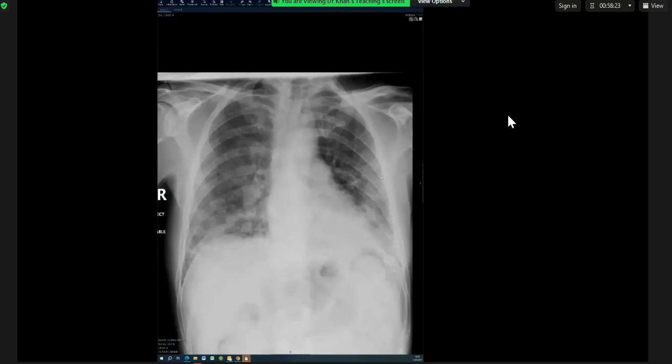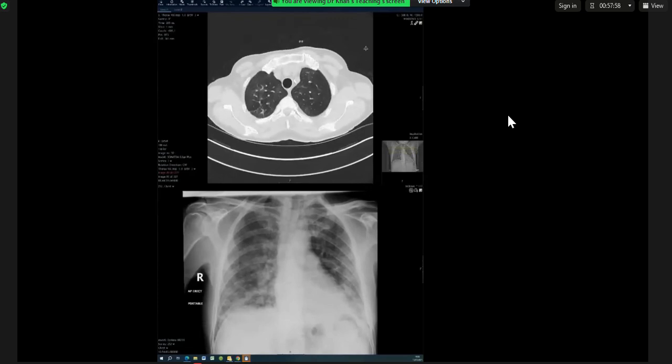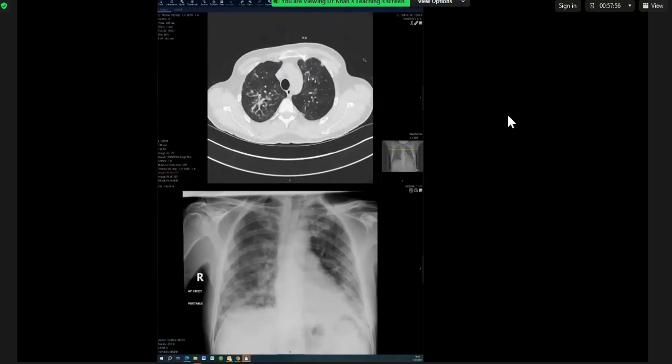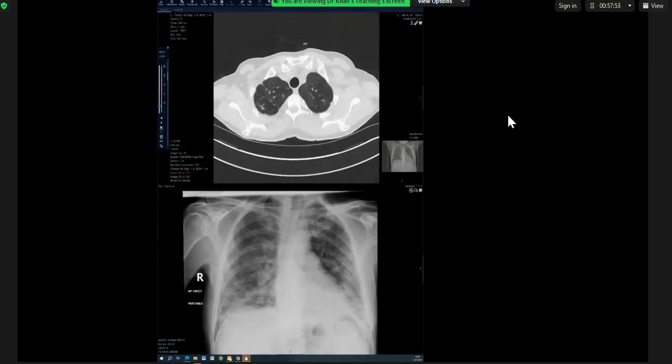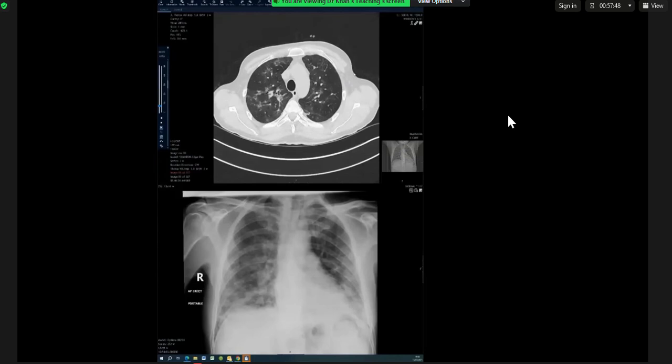I know vasculitis can pretty much look like anything, but you want a bit more mixed picture. You want nodules and consolidation and a bit of everything going on if you want to think down the vasculitis line. This is more, like you said, it almost looks like pneumonia on both sides. And I think it is a pneumonia of sorts, but what kind? Pneumonia means airspace filling up with something, so it doesn't automatically mean infection. This can be a type of interstitial pneumonia, not infective pneumonia.